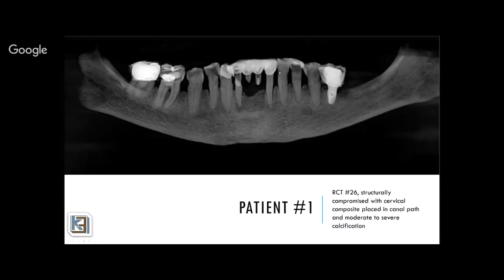This is actually not a bridge. This is a lingual metal plate that works as a periosplint. That periosplint used to be holding those lower front teeth together, and over the years she developed more perio disease and she lost those two. Periodontists kept on cutting them one after the other. Now that plate is totally holding on those two laterals there and the canine here.